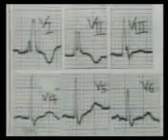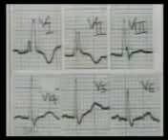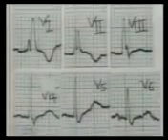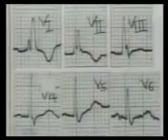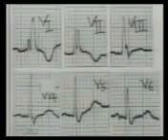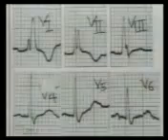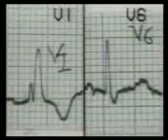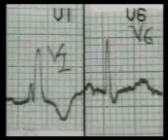This is another ECG of right bundle branch block. Note the RSR' pattern in V1, typical rabbit ears in V2, and shallow but wide S wave in V5 and V6, that is right bundle branch block. Note in close-up view, RSR' in V1 and wide S wave in V6.